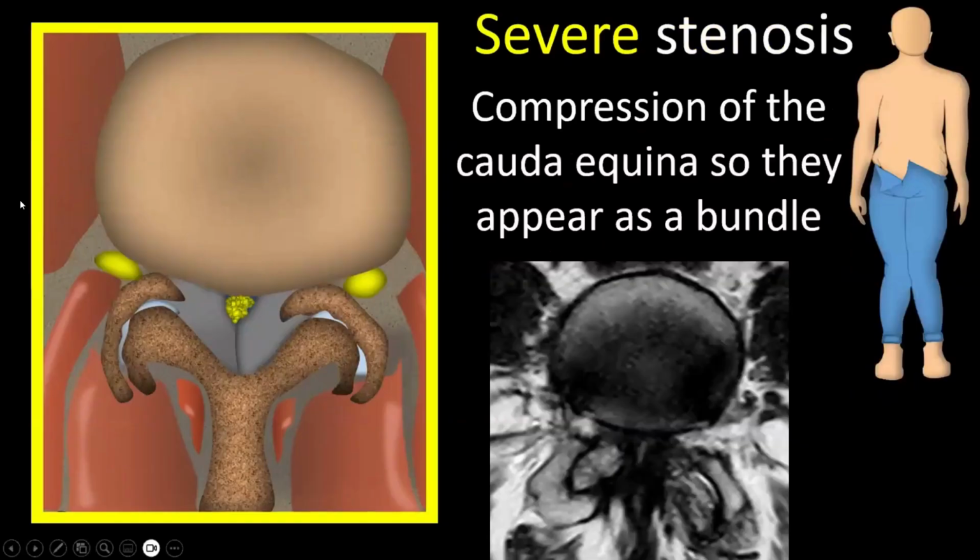Now, for severe canal stenosis, these are your jeans from high school. You do not fit in them at all. So the canal doesn't just hug up to the nerve roots, it compresses them. Kind of like, if you have a big meal and you're trying to get into tight jeans, your belly is going to get squished and deformed in order to fit. Same thing with the nerve roots. They're squished. You cannot separate them from each other.